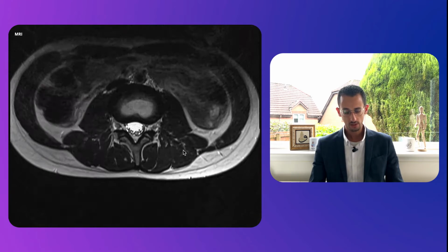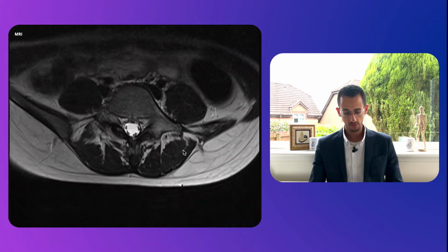What you look at through here, let's take that level for example, is the vertebral body. Here we have the lamina on one side, and another lamina on the other side. That's the spinous process towards the back. So that's posterior, and here is anterior, towards the abdominal cavity. This is the psoas muscle, a big one here, and this is the other one on the other side. And here are the paraspinal muscles on each side.